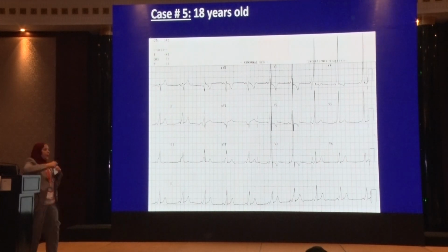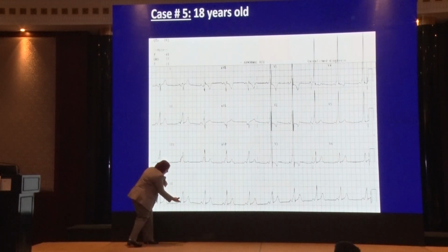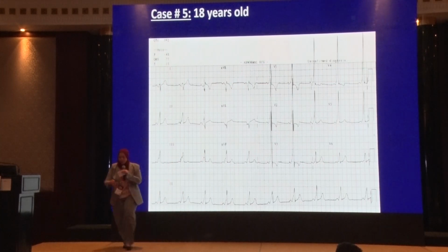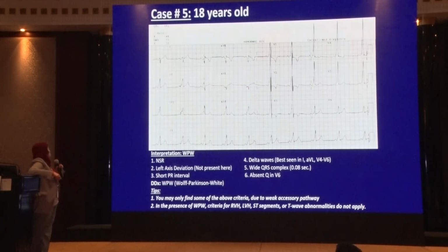We have a very short PR interval, and usually this complex should not be coming like this. It should not be slurred. It should be straight, okay? So this is what we call pre-excitation, Wolff-Parkinson-White syndrome. So this patient is in normal sinus rhythm.